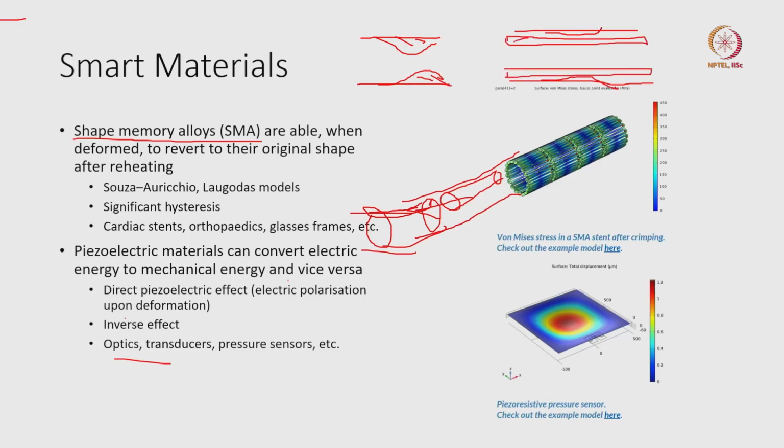So, this is the stent, which will help increase the blood flow in the center. Here you can see that the blockage is impeding the flow of the blood. It is not allowing the blood to flow that easily, but after the placement of the stent that you see over here, the flow is now comparatively better.